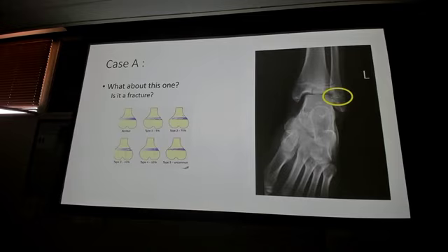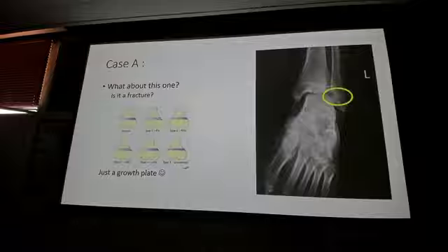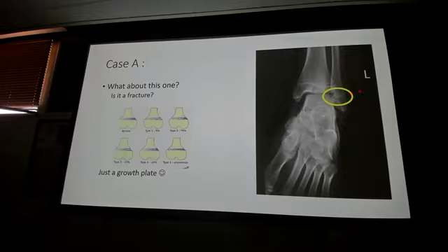It's similar to the non-broken. It looks similar to the not broken one, but what's the difference? I don't have a fracture in the epiphysis of the fibula. It's a different bone, right? So it does look similar, but I also don't have a fracture in the metaphysis or the epiphysis, and if I draw my cortices, it's lined up, so I don't have a Salter-Harris 1. I don't have any slippage. So because there's no other abnormality, that's just the physes.